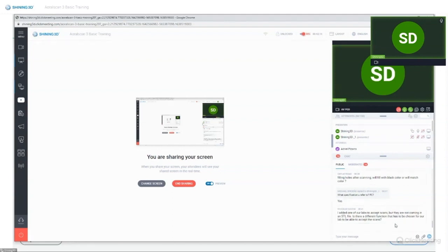So actually, you need to transfer your file format. There's a list that you can choose in the dental cloud, and after the transformation, you can download the STL file. So I will remember your question and answer later.